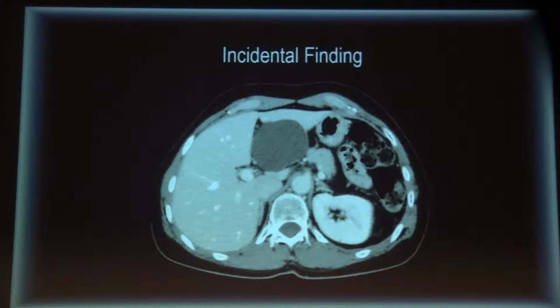This is a young patient who presents with this incidental finding. There is a very simple appearing cyst in his liver. But since he originated from Eastern Europe, we decided to take serology, thinking that even though it doesn't really look like a Hydatid cyst, it could represent a Hydatid cyst, and serology was positive. Serology is positive for Hydatid cysts in 60 to 80% of the cases.